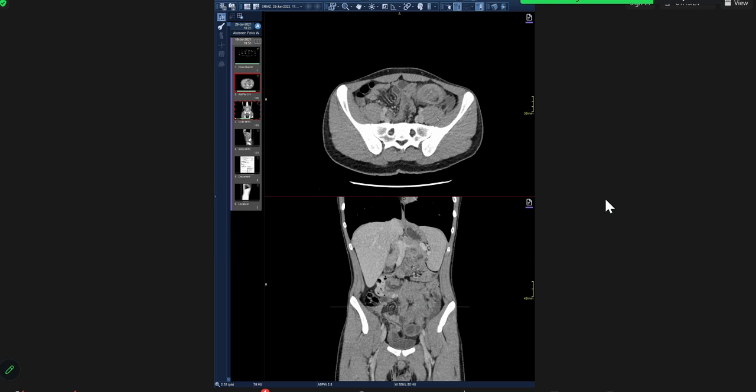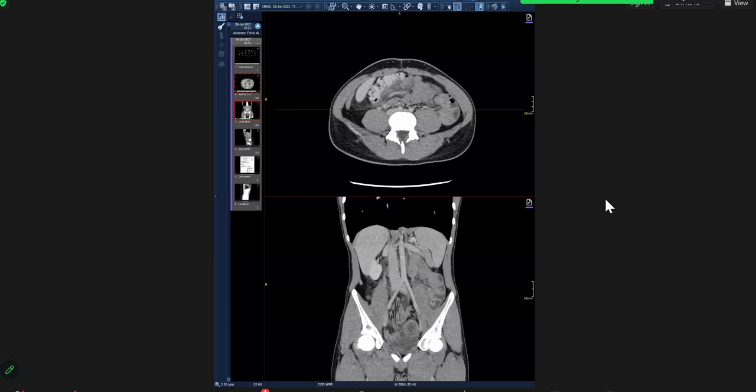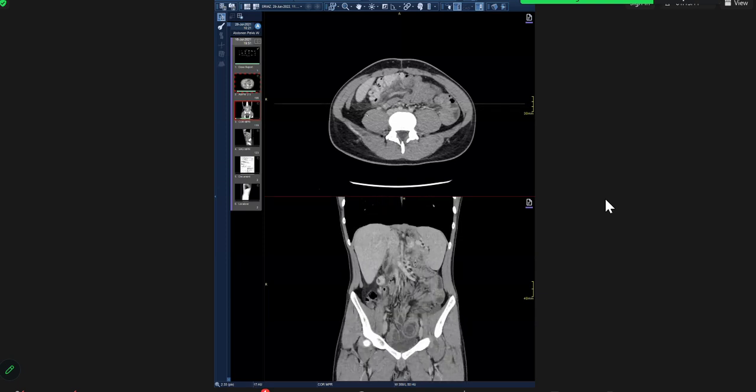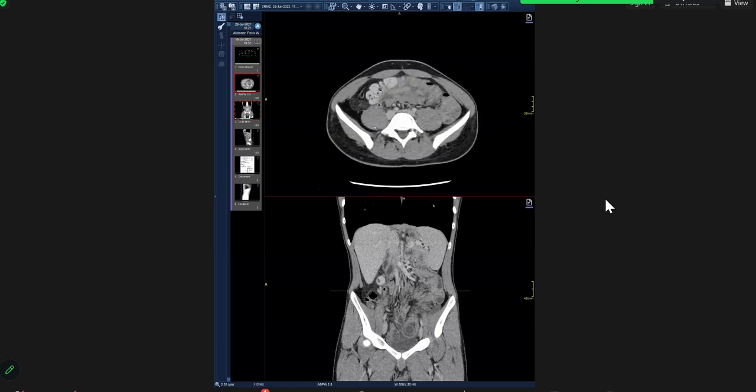Emergency is one of the biggest things that comes in this exam, one way or the other, and they show you a lot of these kinds of cases. So I kept trying to tell you that the patient has lots of abdominal pain. So you see all this peritonitis here, inflammatory changes, see that? So why would the patient have these changes in the right iliac fossa? It's a 23-year-old. If you didn't see this, what would you think first as the diagnosis?